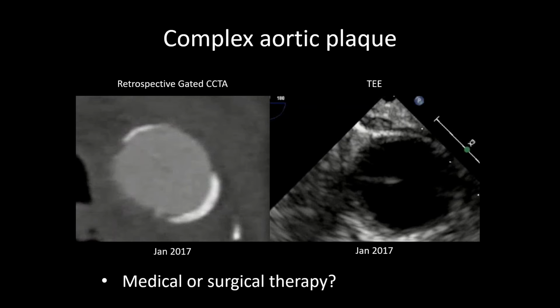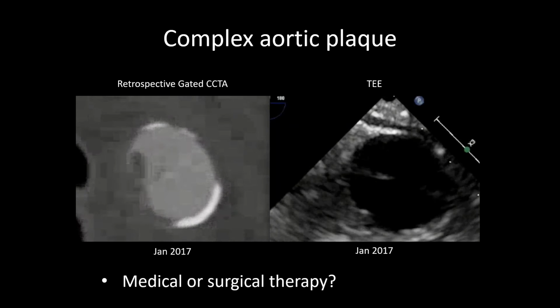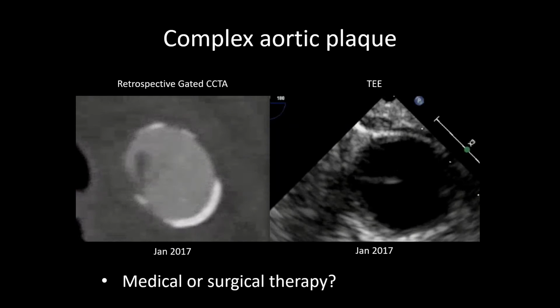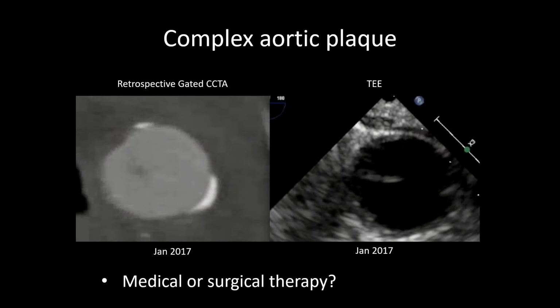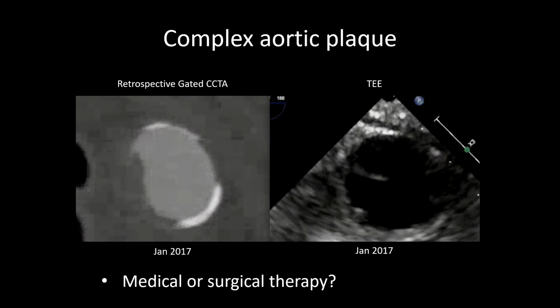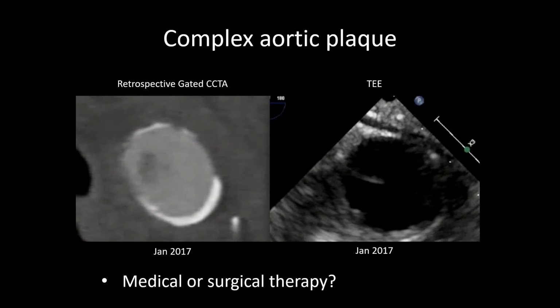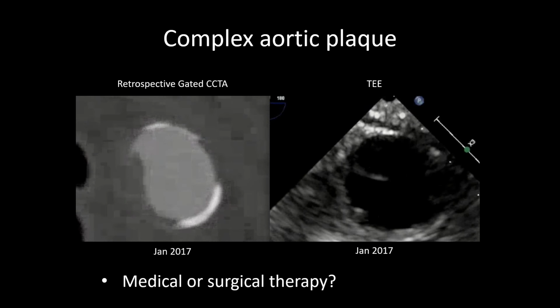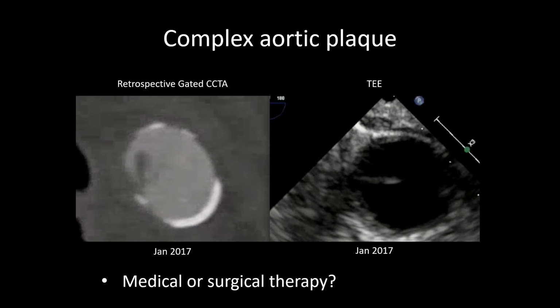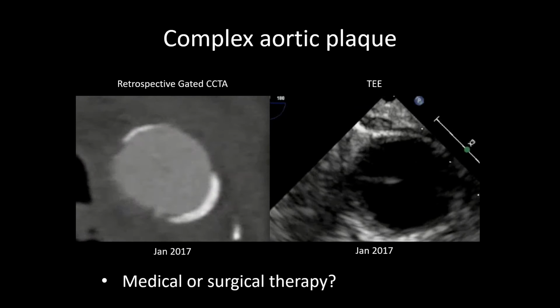Oh, that's very pretty. And there's no indication of any chronic dissection from what you see in the aorta? No indication of dissection. The thought initially, with a still image, was that this could be either thrombus or a dissection. My initial concern was more that this was a dissection just because of the way it looked. And so we raised that concern to the interventional team because her initial presentation was acute coronary syndrome, even though it was very vague symptoms, very mildly elevated troponin, but the wall motion abnormalities were there. She certainly had some bronchitic changes, etc., and she was treated for bronchitis.